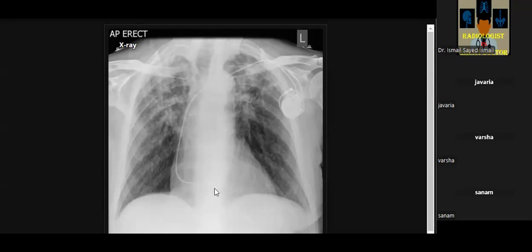A single lead, so the tip is present in, are you sure, in the left? Yes, it is extending inferiorly up to the left ventricle. If I said, are you sure? Just revise yourself, okay? We place a cardiac pacemaker in the right, either right atrium, or if dual device, right atrium and the right ventricle. No leads in the left, okay?